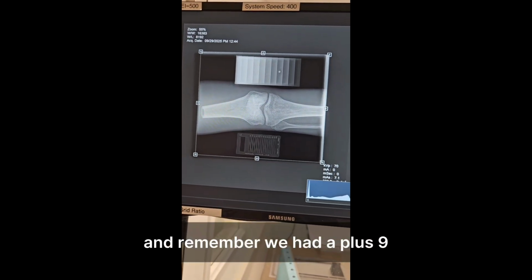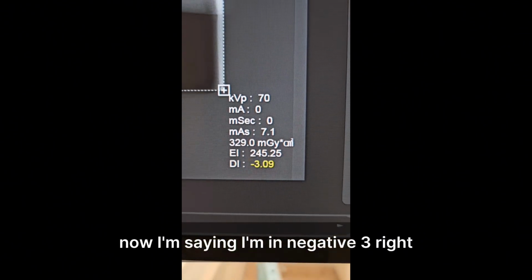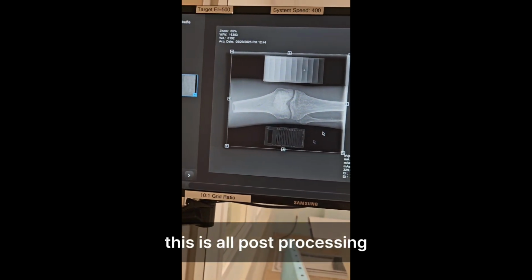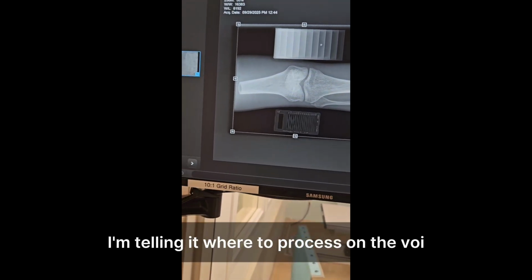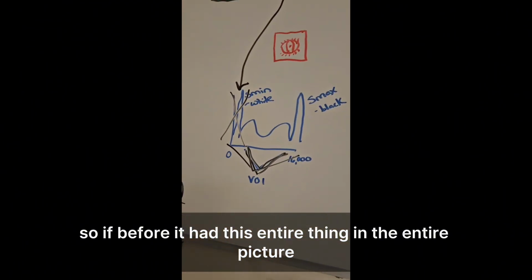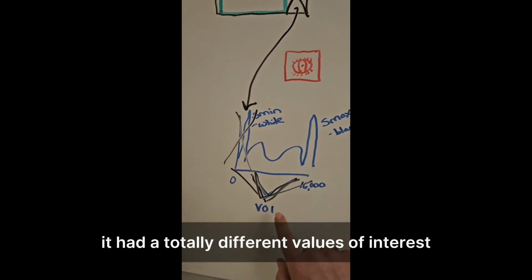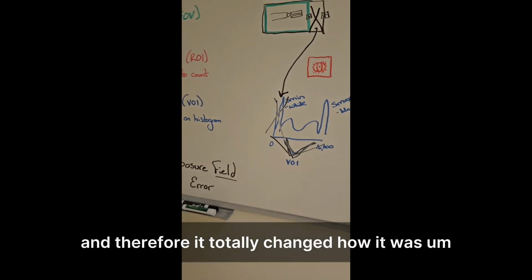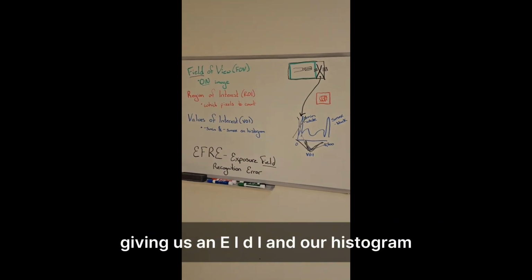And remember we had a plus 9? Ugh. Now I'm saying I'm a negative 3, right? I haven't changed a single thing. This is all post-processing. I'm telling it where to process on the VOI. So if before it had this entire thing in the entire picture, it had totally different values of interest in terms of how it was processing, and therefore it totally changed how it was giving us an EI, DI, and our histogram.